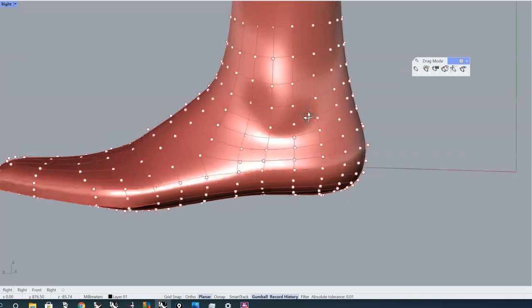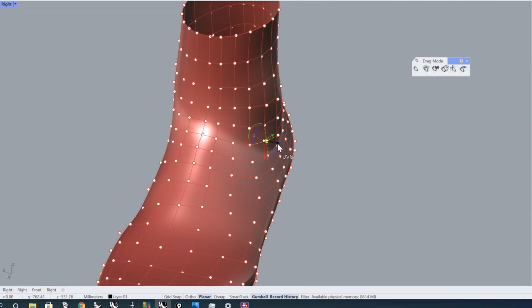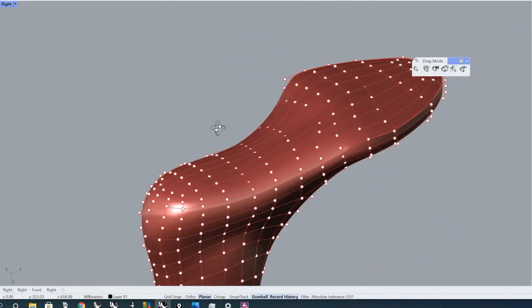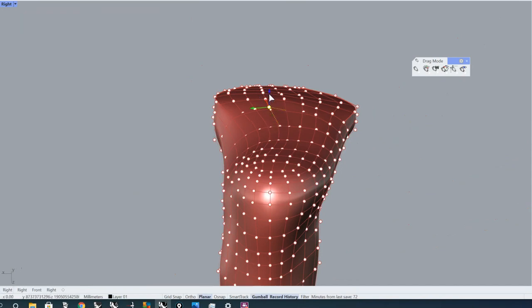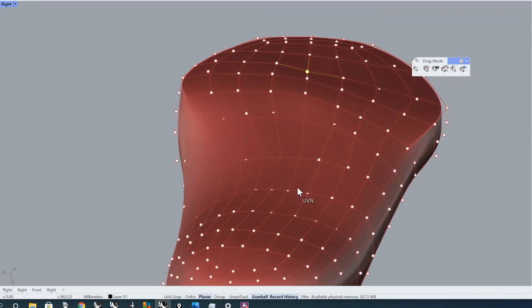There's not really a point where you can say, okay, now I'm completely satisfied with the shape. You can go on for days if you want. It's just a question, when are you happy with the shape or not? The most important thing is that now as a shoemaker I can model the last in any way I want. A lot of CAD systems don't allow me to do this, and this is what I want to do as a last maker. And if you have certain ideas about what shape you want to make, it's very annoying if you are not allowed to model it in the way that you have in your mind.